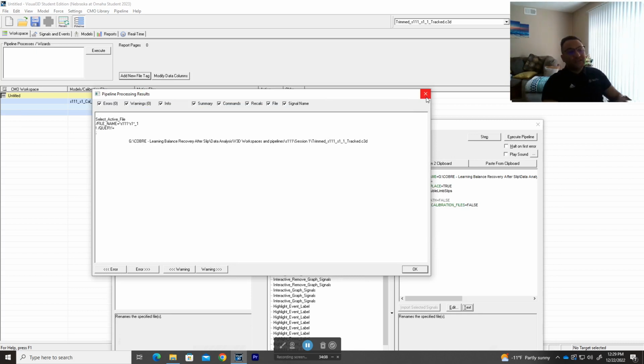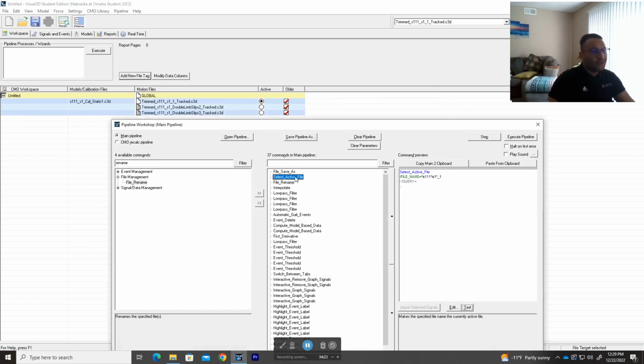Yep. So like I said, the problem with Visual 3D, because it is not open access, is that you'll have to do a lot of trial and error and a lot of outside the box thinking to fix your problems. I didn't know about this, for example, but now I tried it and it works. Again, you can be very specific, or you can do this.